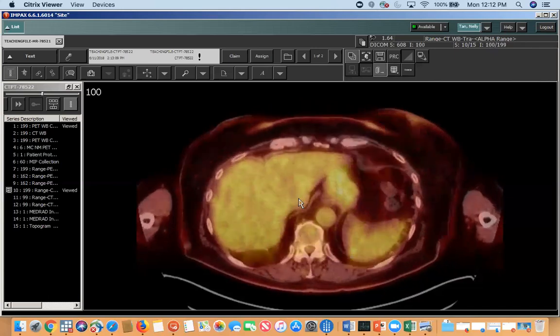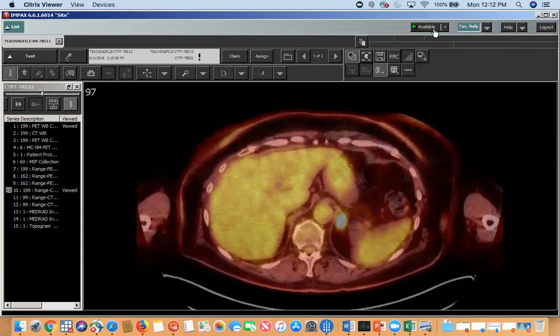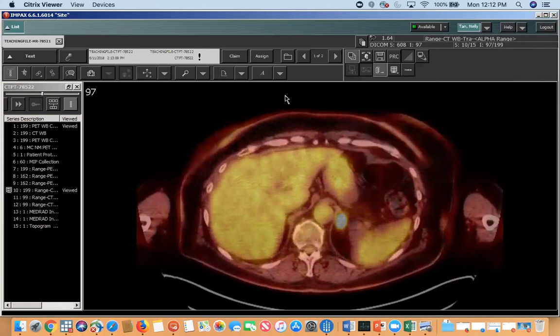What about Victor or Melina? Have you guys seen anything like that? The collision tumors? No, not collision, just heterogeneity. You don't need to have the whole adrenal adenoma drop out in order to call it an adenoma. Right. Not all of it does. It's usually heterogeneous.